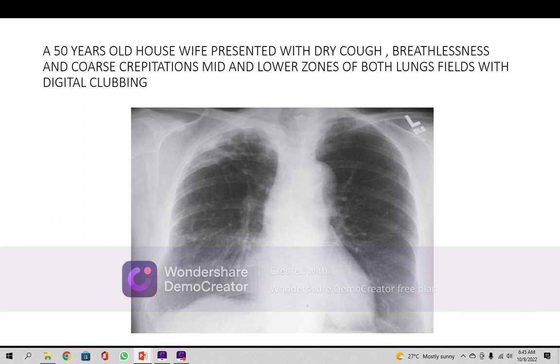Interpretation is that the trachea you see here is turning here like this. So there is something going wrong in this area which is pulling, because there is no force outside here, the trachea to the same side. The apex here is full of homogeneous opacity. Lower down, there is compensatory emphysema in both zones, middle zones, upper zones. Both lower lung fields are involved.